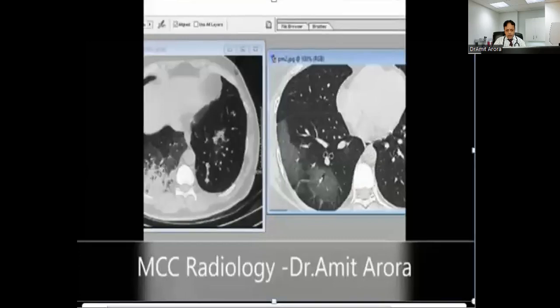I have taken different CT scan clips, and these are the videos. Just ignore this. I have taken this part just to stamp, copy from the picture, and put it over here. Because in CT, you cannot see the progression. You cannot get a CT every day. So how the consolidated ground glass opacity gets converted into a halo sign or reverse halo sign is what I have tried to demonstrate in this video.